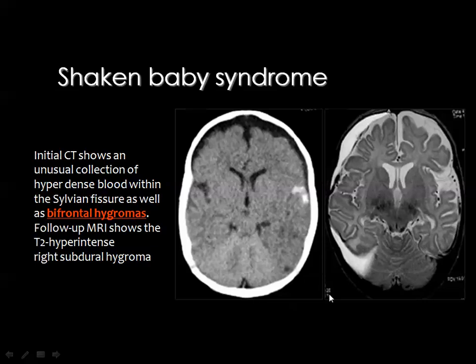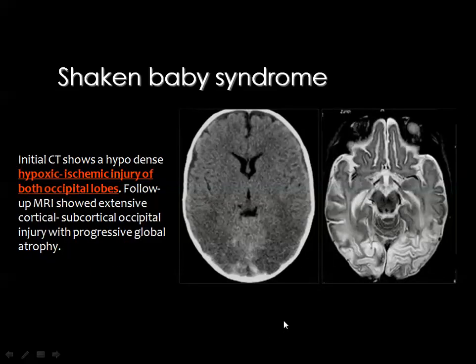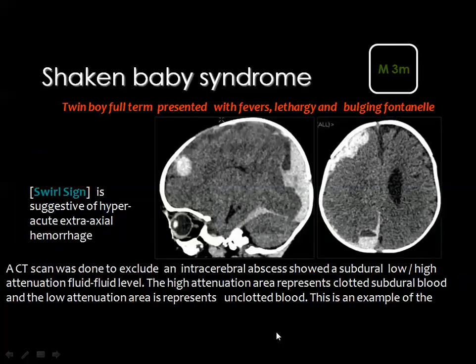And this is also an example by MRI T2 weighted images. And here you got damage of the brain vascular blood supply with extensive hypodensities in the occipital lobes seen by CT and also by MRI T2 weighted image. They are of bright signal, and this will progress into brain damage and atrophic changes and permanent insult, of course.